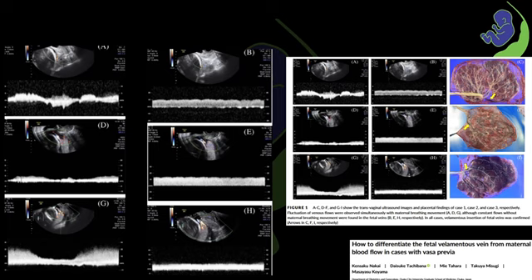Some of the other common differential diagnoses are uterine artery or venous varicosities, amniotic bands, chorioamniotic separation, or placental edge sinuses. All these mimics can appear as a linear or tubular structure near the cervix on grayscale imaging. And in such cases, color Doppler and pulse wave Doppler are extremely helpful to differentiate. Therefore, if the vessel shows an arterial waveform pattern that matches the fetal heart rate, and after excluding funic cord, then it is likely to be a true fetal vasculature, confirming the diagnosis of vasa previa.